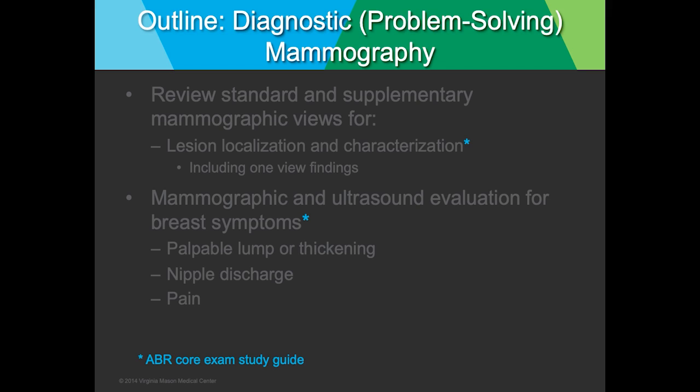I will cover standard and additional or supplementary mammographic views for lesion localization and characterization, including one view findings. I will also cover mammographic and ultrasound evaluation for breast symptoms, including palpable lump or focal thickening, nipple discharge, and pain. I will also briefly cover some tomosynthesis during this talk.